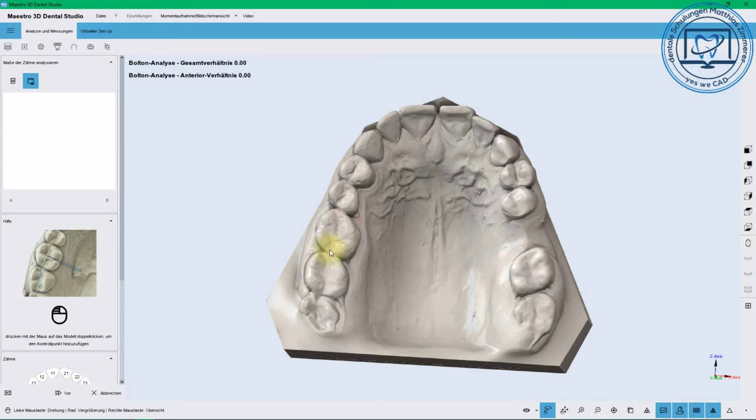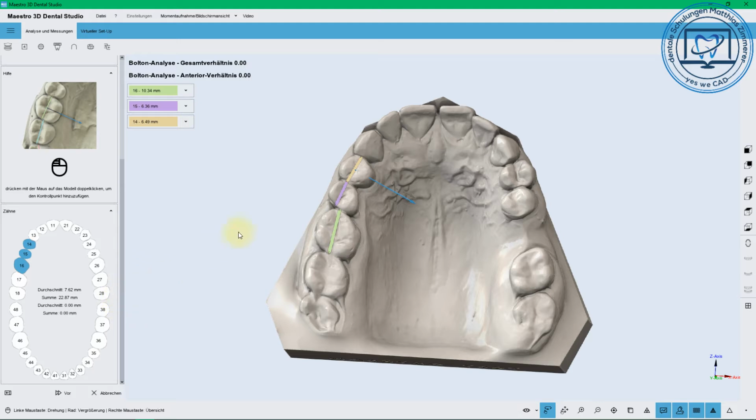And then we are going to the tooth segmentation, and first we have to set up the wideness of the teeth. You have a fine adjustment possibility, and always keep in mind, if you make the first 2 points, set up the numbers. If you start from the first, in this case the 1.6, you just have to put in the number of the tooth the first time, and if you go ahead, the next numbers are already the right ones. You have it here in the schema also.